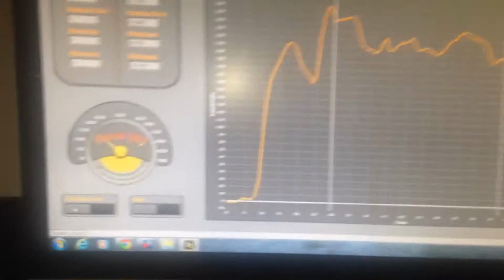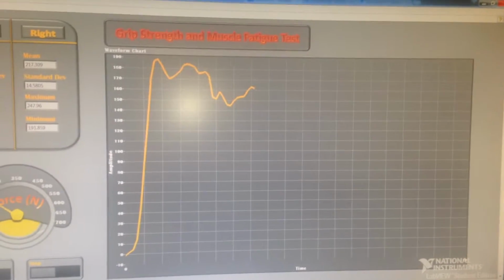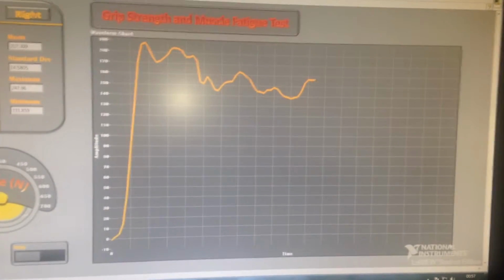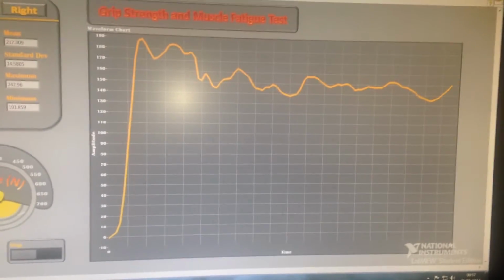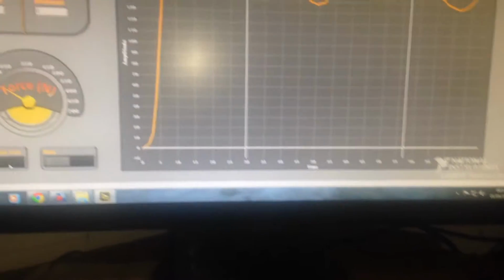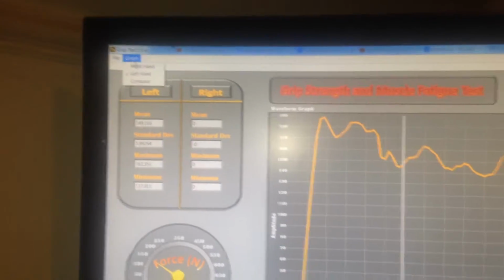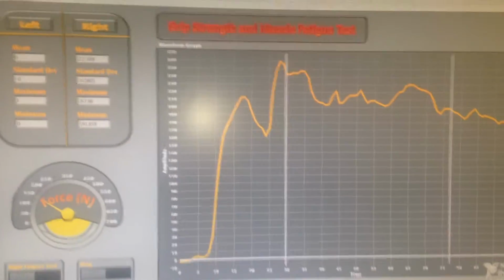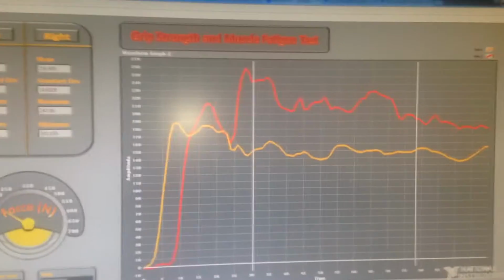As you can see here, it then says left hand test, so obviously there'll be a left hand. This is halfway through. There's also going to be right fingers, left fingers. It's just what I've been asked to do. And obviously now you can go to the graph and you can pick between your last 2 runs and you can compare them and all that.